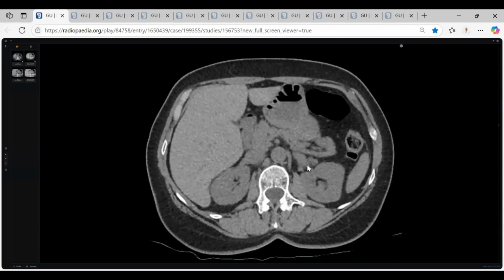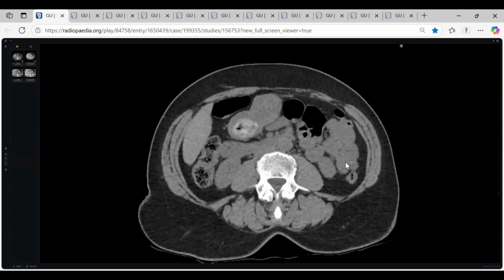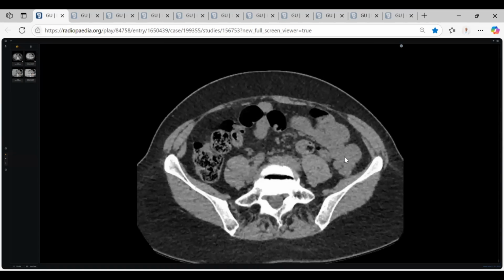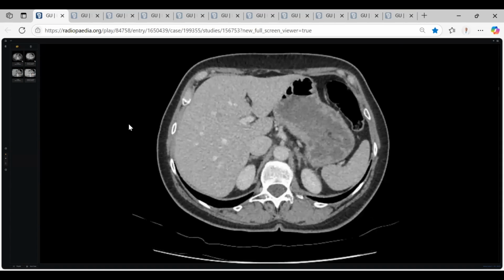Apart from that, I could see a soft tissue density lesion along the left renal vein, which is separate from the left kidney. In my routine practice, I would see contrast weighted images to characterize this further. Before that, I would scroll to the pelvis. Do you need any other phase? Yes, sir. I would like to see the arterial phase, the corticomedullary phase. This is arterial phase.